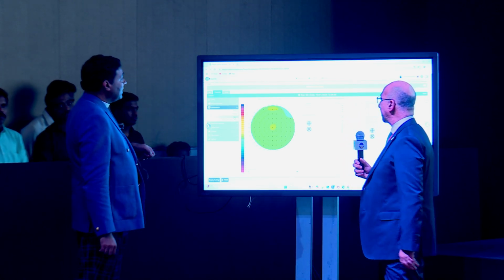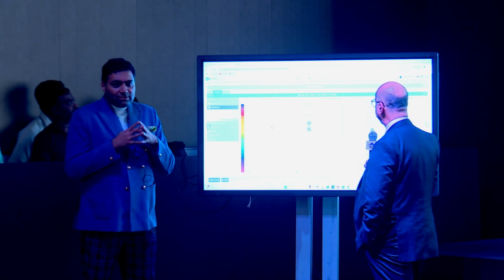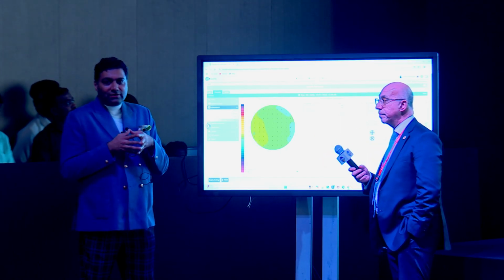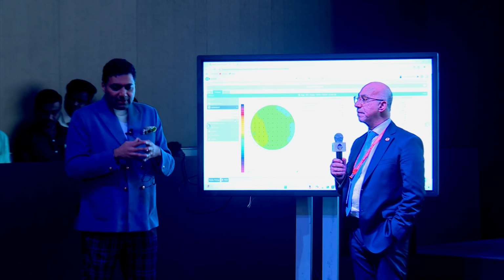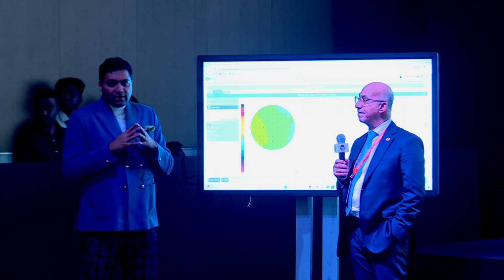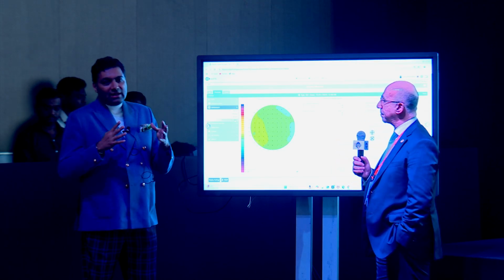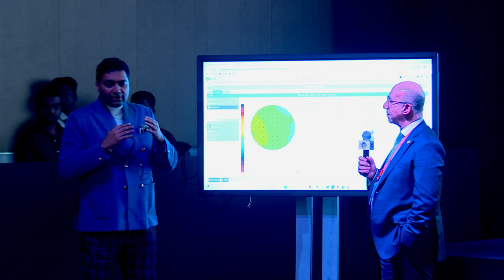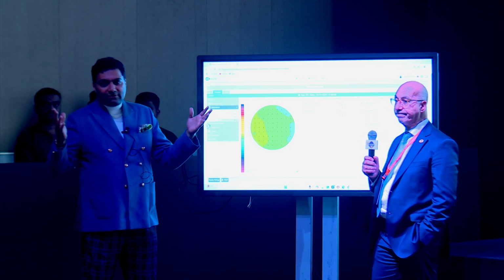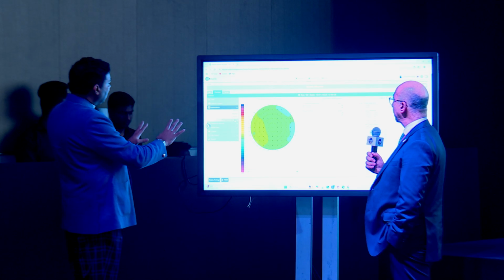And then it goes to the pachymetry. What we are trying to do is, the most important thing in any refractive surgery when you're doing a customized ablation is the repeatability of the machines you use. If your repeatability is way off, 10 to 15 microns here and there, and 6 to 10 microns of epithelium, you end up in a disaster, because you are treating a different type of coma, a different type of ablation. So now we know that this patient's repeatability is perfectly all right.